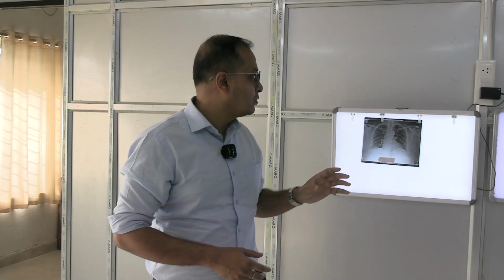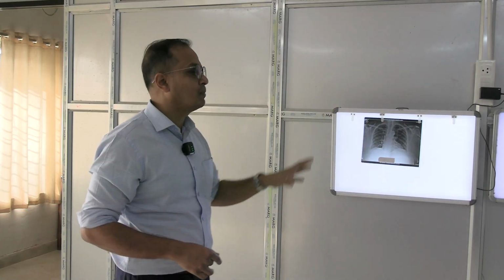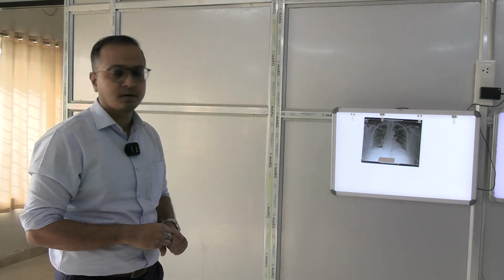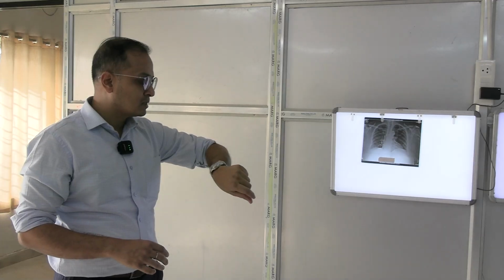So go into this sciagram picture, identify these plates, how we are seeing here, and see whether you can figure out the borders of the heart, margins of the lung, like inferior margin, superior margin, apex, base, mediastinal borders and sternocostal border, etc., diaphragm shadows, inferior border of heart, right border of the heart, left border of the heart, and so on, right? So you have 5 minutes to figure these things out. Then I'll be throwing random questions. All right.